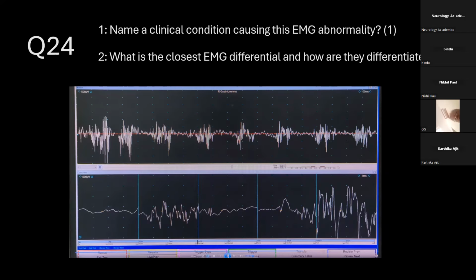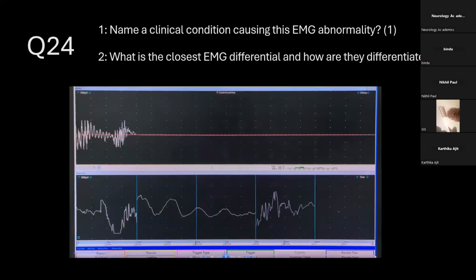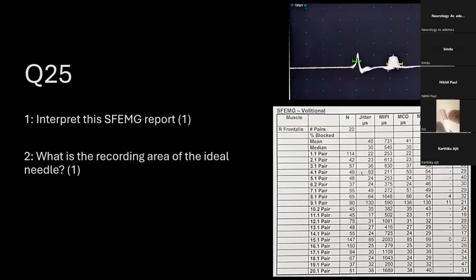Next question. Interpret this single fiber EMG report.